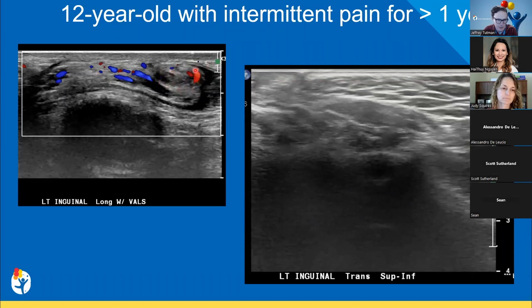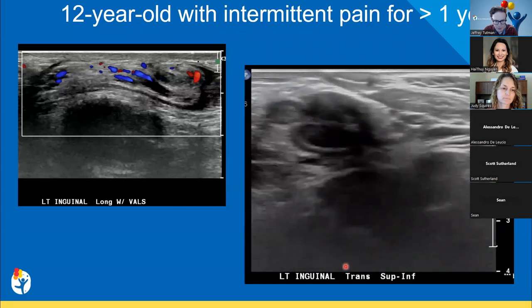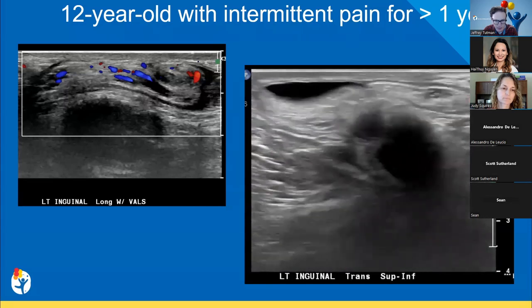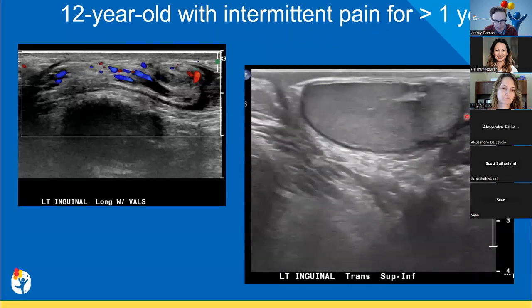But I think this again could be confusing to just kind of call this an epididymitis and kind of funiculitis. But our sonographer again kind of astutely obtained that transverse image through the cord. So we can see as we get down into the inguinal canal and just right above the scrotum, can see that very discrete twist in the cord. So again, I said this was an outpatient. So we emergently sent this patient over to be evaluated in the ER.